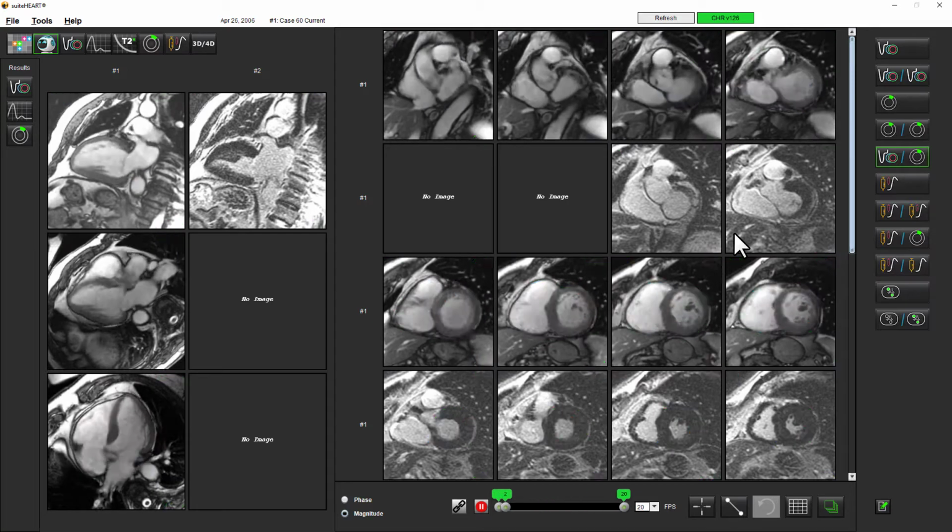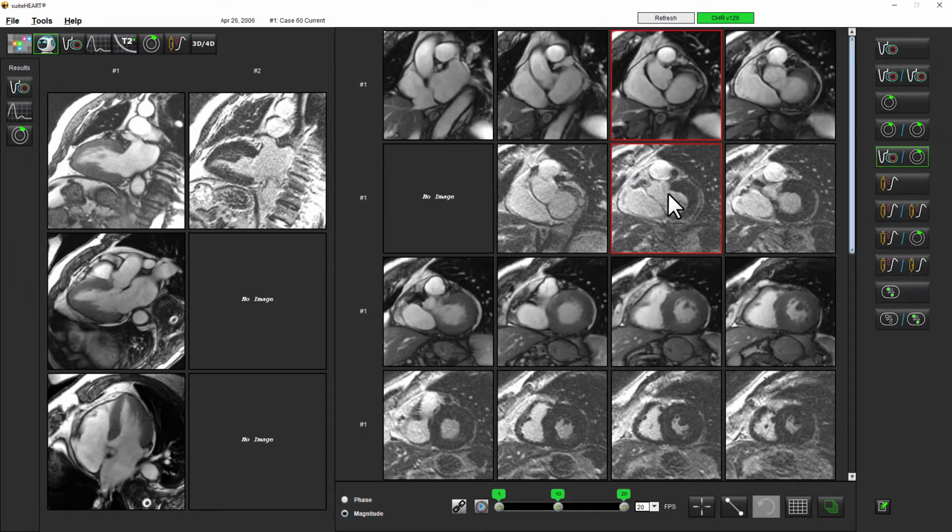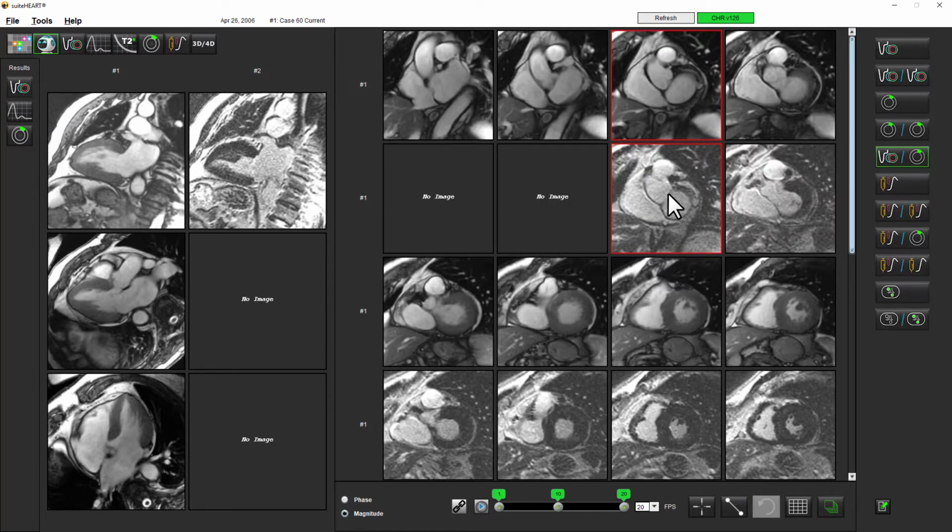Again, I'm going to toggle off the annotation, and I can pause the images here, and you can see in this comparison, Virtual Fellow will display all of the functional images, and it will select those late gadolinium images, and it will display them below their corresponding functional image. So you can see that this functional image was matched up to this late gadolinium image, and so forth and so on. If for whatever reason you disagree with a matchup, you can adjust it by using the arrow keys, by just selecting a pair of images and using the arrow keys, you can slide the images back and forth.